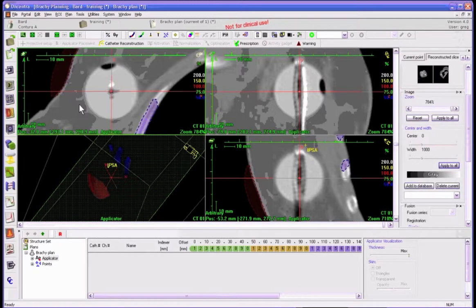For some planning systems where you can't be certain that your orientation is the way we've set it up here, it's useful to place a marker in one of the other channels. Here they placed a radiographic marker in channel 2. You can see it in this view quite well, and that is just a solid wire that's been placed in channel 2. So once we bring our axes to the center of the balloon and we rotate around so that they cross through the channels, all 5 of these channels will be displayed over their entire length in one view or another.